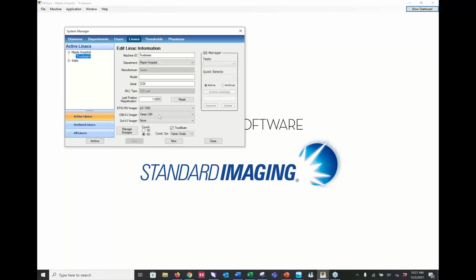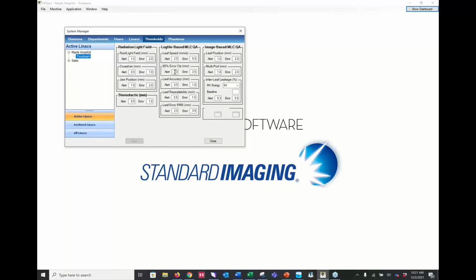Your LINAC setup as well. You can set up your different LINACs, serial numbers, MLC type, whether you have a 3D or 6D couch, things like that. So it's a quick and easy setup there as well. Your threshold page, setting up those thresholds. Like I said, it comes preset with the TG-142 tolerances, but you can adjust those, tighten those, or loosen those as you see fit.